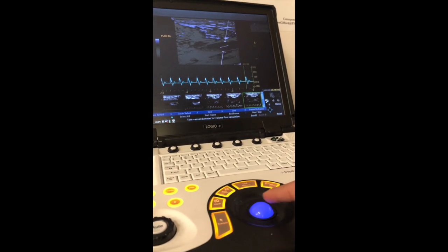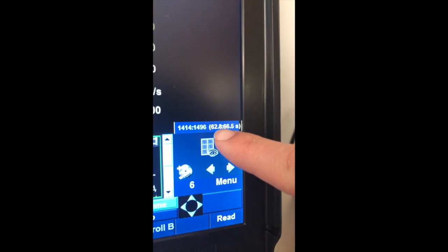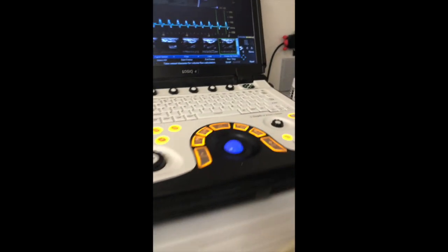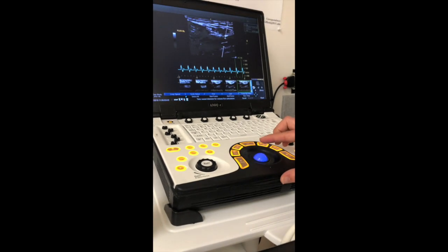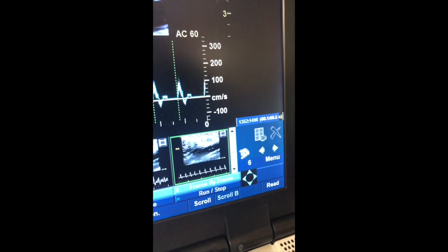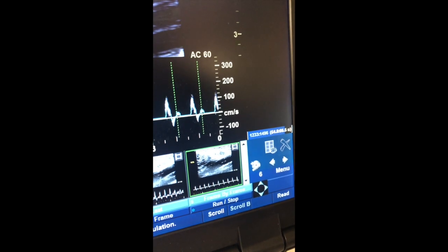So now I'm able to scroll, and I'm watching this number right here, the time, so that we can get every 12 seconds. We were at 66 seconds, so we're going to go down by 12. We always analyze from the end on baseline. So down by 12 is going to be 54. Gotta do some quick math on this one. So now I'm going to go to 54.